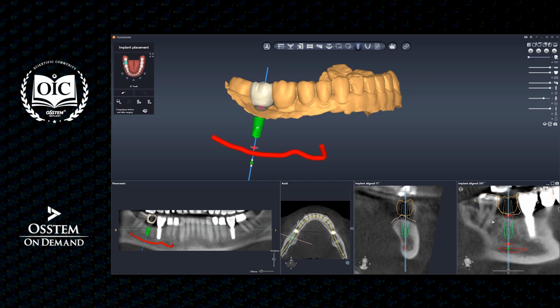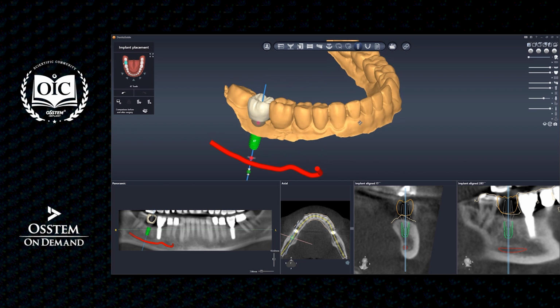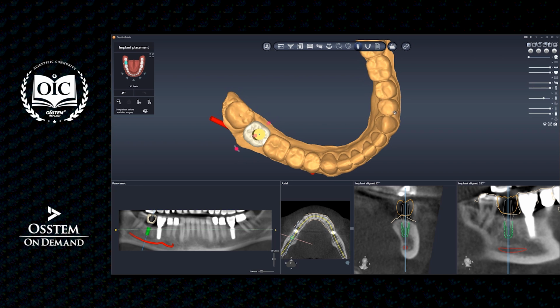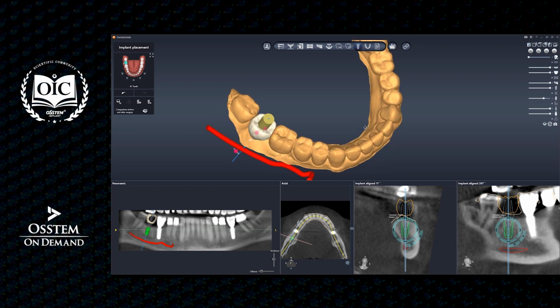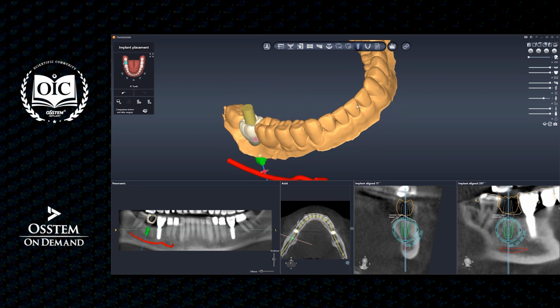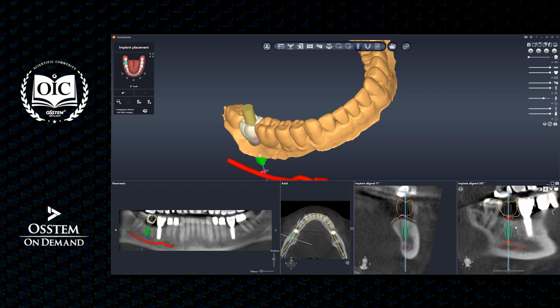And of course, if you have enough tissue, I mean bone, that would be great. Or you can realize that you need to make additional surgery or GBR or something different, or a different size of the implant. So that is how we can plan implant positions having the proper library.